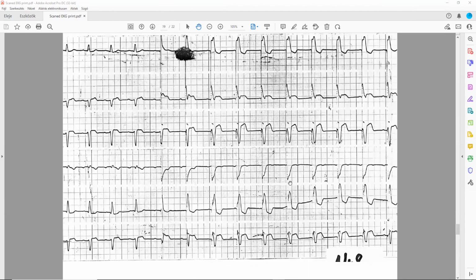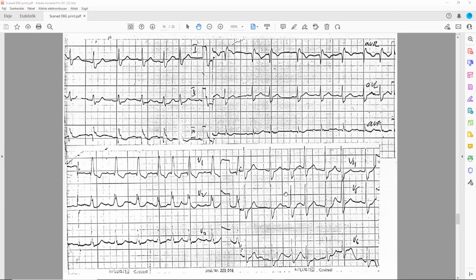Okay. All right. I'm sharing another one. Okay, wait a minute. I'm going to share another tracing. Momento. Yes. Okay. Oh, yeah, that's great. I like it. Maybe you won't. Okay, good.